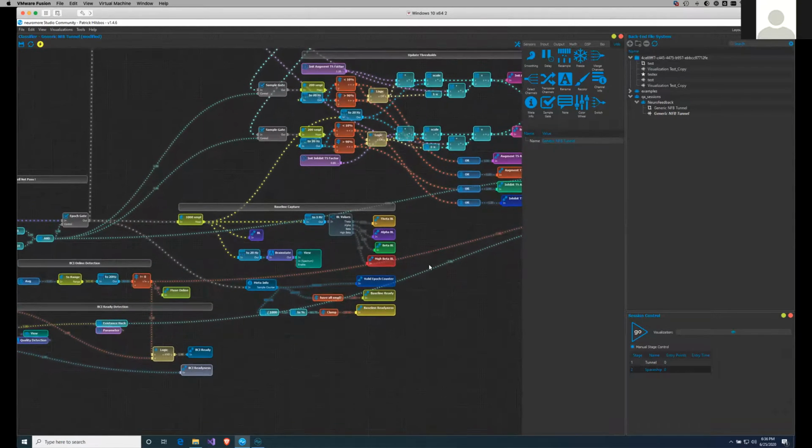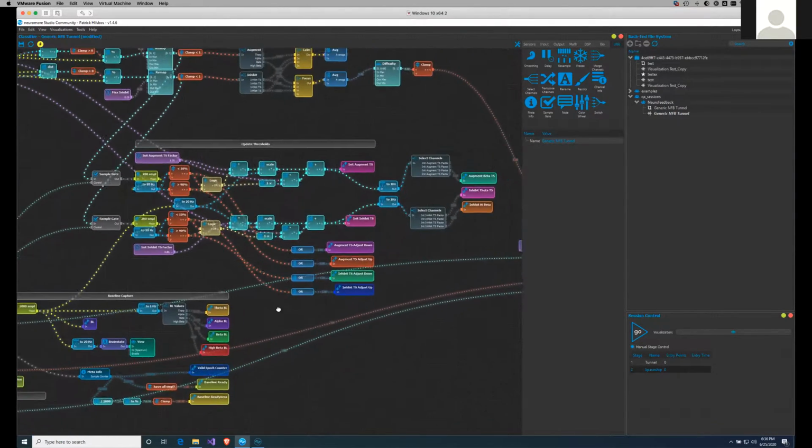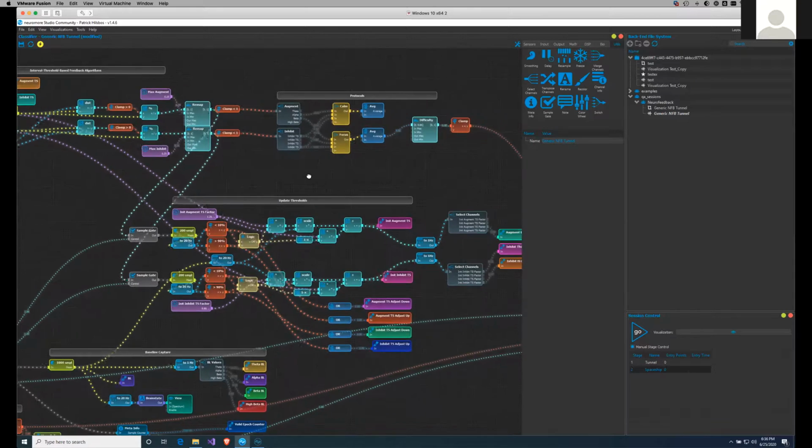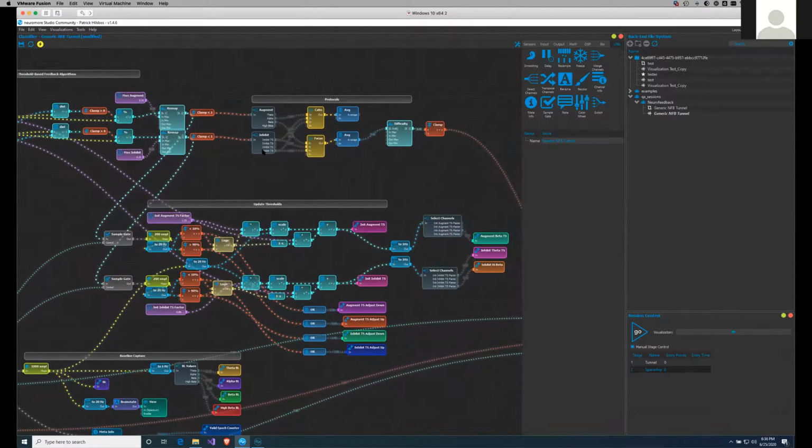Then we have a little baseline capture in here. We're taking 1,000 valid epochs to determine a baseline. That particular classifier takes a theta baseline, alpha baseline, beta baseline, and high beta baseline. Thresholds are being updated. Up here, we have the protocol. Currently, it's set in that configuration to inhibit certain channels. Like I already mentioned, that's not medically validated. It's just something that we created for demonstration purposes.